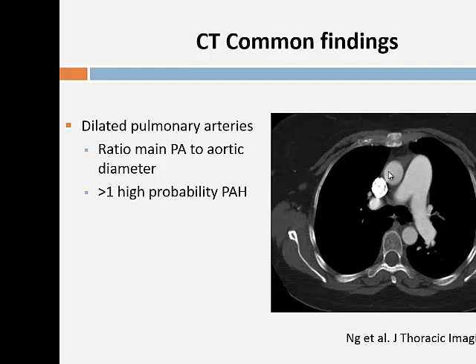The other thing that you can look for is the absolute measurements, and what you do is you just measure AP. Okay, so this is the main pulmonary artery. That should be anything between 30 to about 32, maybe even 33 millimeters. I tend to use 30 because it's easier for me to remember. And the left and right should be about 22, 23, that sort of thing. Okay, so if they're bigger than that, there's a chance they may have pulmonary hypertension.